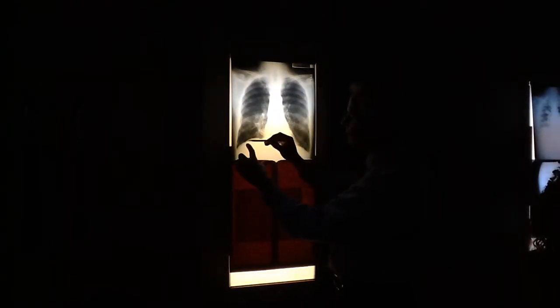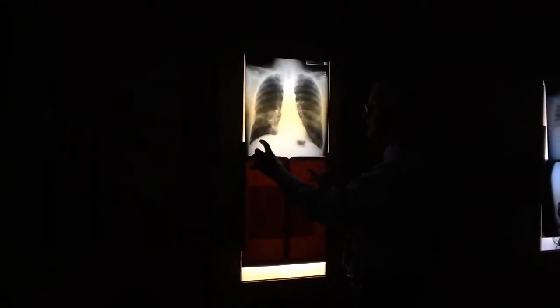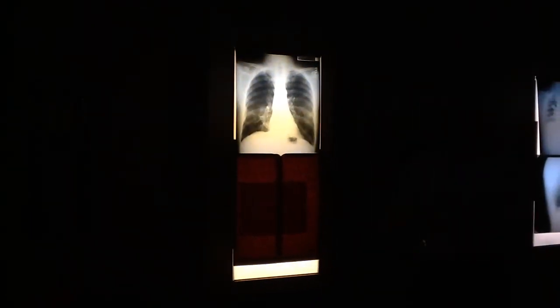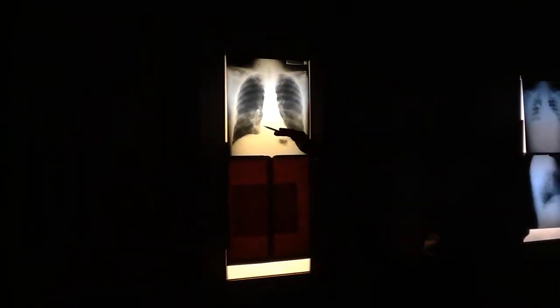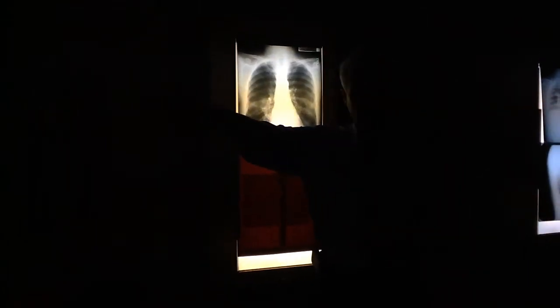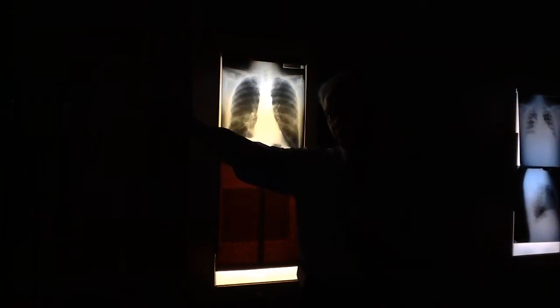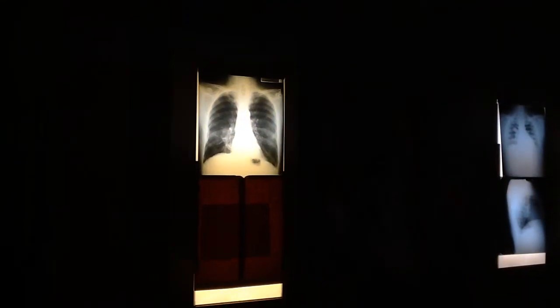This is just below the top of the diaphragm, that little bit of linear calcification. Remember we said it's pathognomonic when it's over the surface of the diaphragm. This is the precursor to mesothelioma. That's the precursor to asbestos lung cancer from the lung disease. Mesothelioma comes from the pleural disease. And remember, it takes less exposure to do this than it does to do that, and it doesn't take anywhere near as long an exposure.